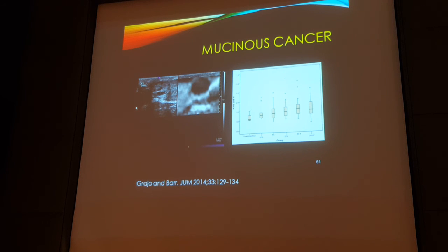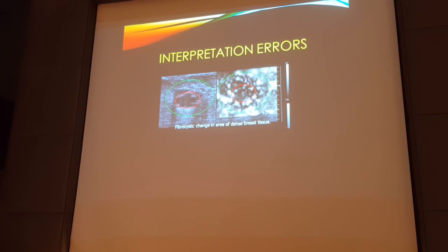And like I said, the reverse is also true with benign lesions in glandular tissue, that you may not see it very well on elastography, but see it really well on B mode imaging. And then we looked at several hundred cases of the diameter or the distance ratio, and here you can see the ratios. And again, the mucinous cancers and DCISs had ratios down to 1. As we got into the more invasive ductal cancers, the ratio increased, and we've had ratios of up to 3 or even greater. And again, this is the problem with strain, is benign lesions.